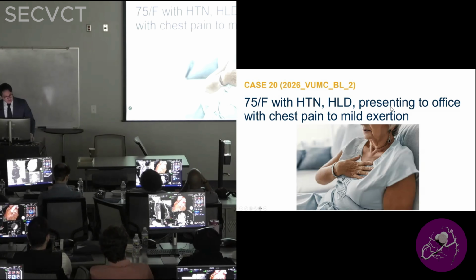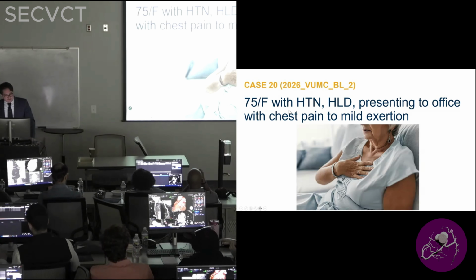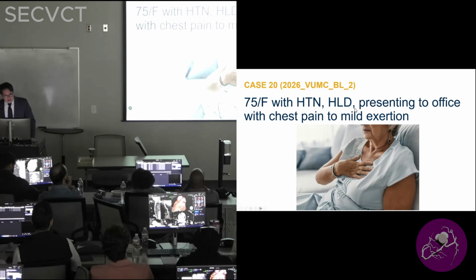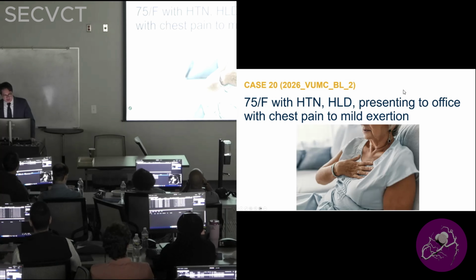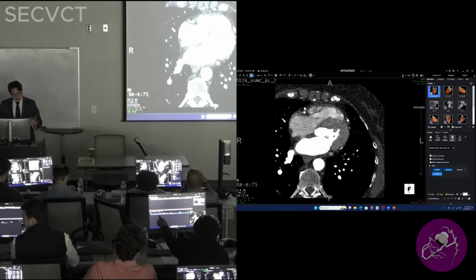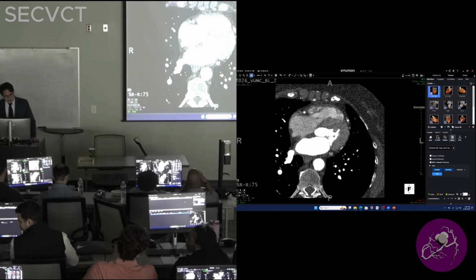Okay, so let's go to our second case. It's a 75-year-old woman with hypertension and hyperlipidemia. She's presenting to your office with chest pain to mild exertion. But I'm just going to do it here, fairly quick. And what I would like to show you afterwards is the FFRct.